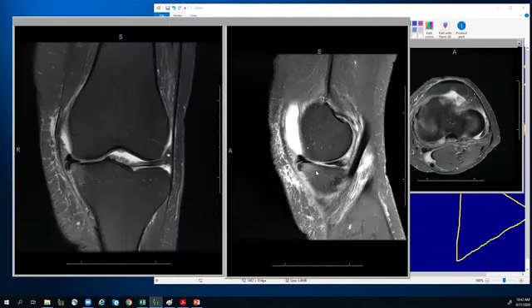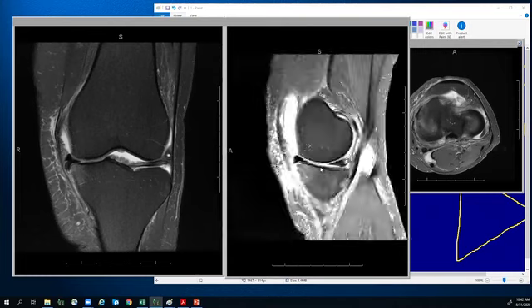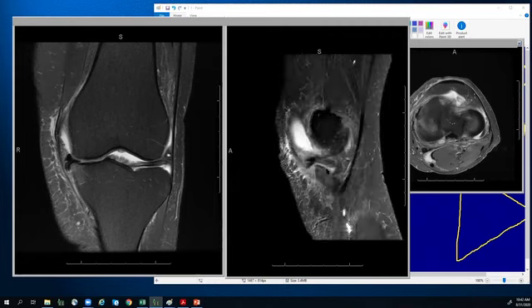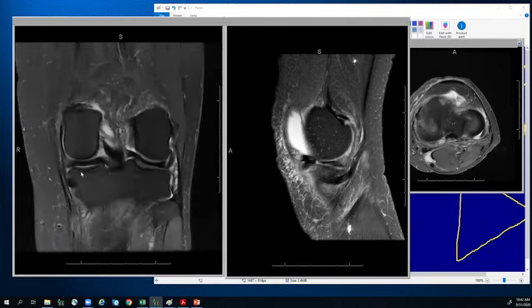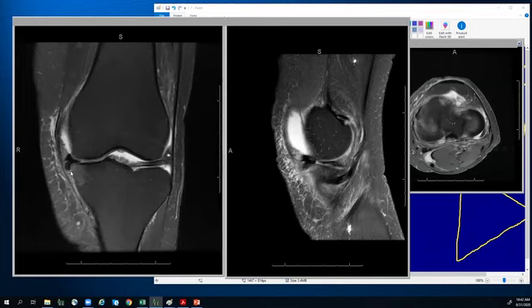All right, so in this case, I'm approaching an area where I am seeing a meniscus tear. There's this kind of strange linear signal that's running vertically. It's only really present for one or two slices. I do see some signs of maybe some volume loss on the undersurface of the meniscus right here. And then I'm seeing this weird meniscal fragment that's located right here. And when I look at this on the coronal plane, as I pan around, here I'm encountering a portion of that tear. And then as I move more anteriorly, I'm seeing this additional meniscal material projecting in the inferior gutter.